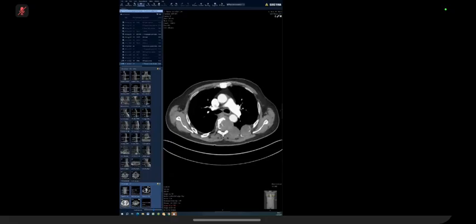And you have to always think of the spine, because you always want to not miss the thing that keeps the patient safe. Don't want to make a mistake like that and get everything right and miss the spine bit, because that makes it hard to then give you a high score on an otherwise good case. Very well done. I will give you a harder one. Oh no.